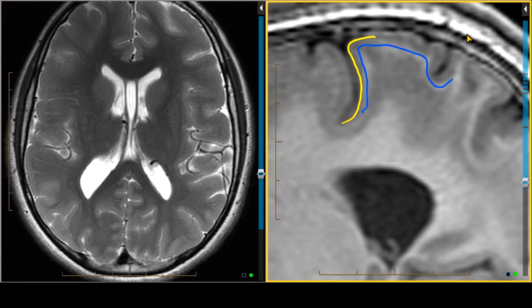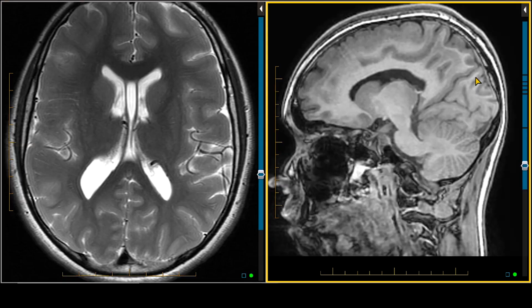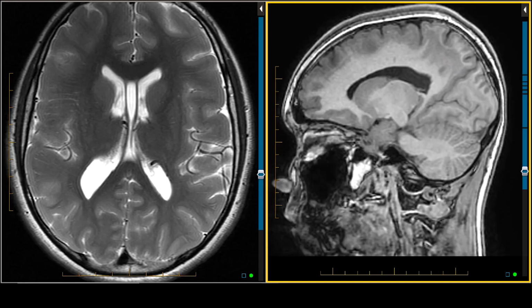The myelinated white matter looks bright on T1-weighted imaging. And then following that, beneath the surface, I'm seeing an additional area of gray matter-like signal. This is band-type heterotopia in the absence of a significant lissencephaly spectrum disorder. The band heterotopia is seen most pronounced posteriorly in this individual. Anteriorly, here in the frontal lobes, we're seeing gray matter and subjacent white matter without band heterotopia. We're not seeing any significant lissencephaly appearance. So this is band heterotopia in the absence of lissencephaly.